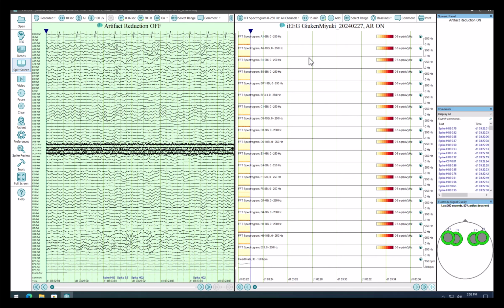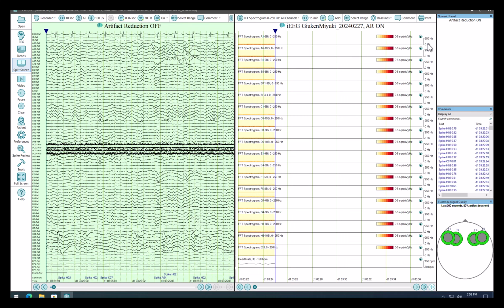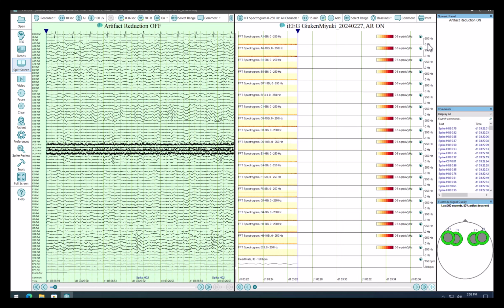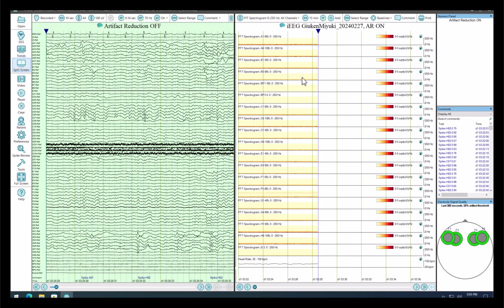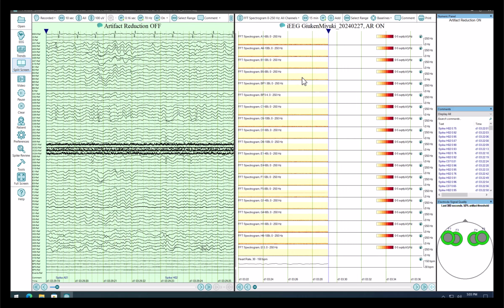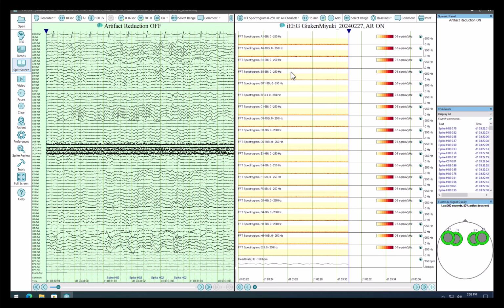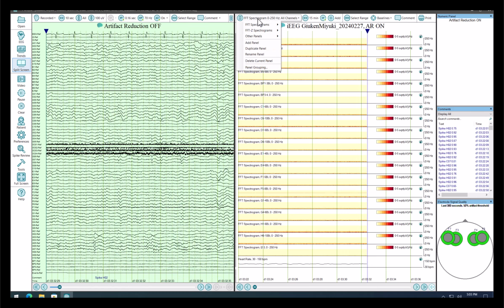Now, while this is processing, we see over here it goes 0 to 250 hertz. That's going to compress things a bit. It's hard to see certain changes when we're looking at a frequency range that large. Again, this standard size is 45 hertz to give us a little bit easier view inside of those. There's some things we can do to help with that, though.